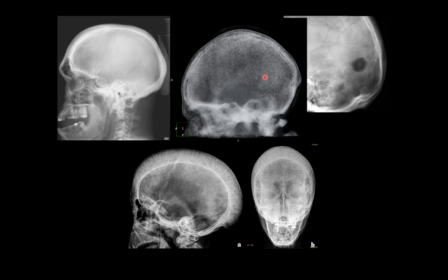Apart from trauma, whenever we do skull X-ray, we can see a lot of other diagnoses as well. It may be infection, trauma, neoplastic, metabolic, endocrine, or whatever. So if you see the first image, this skull is enlarged. This is ballooning or enlargement of the pituitary fossa. The sinuses are also enlarged. This mandible has a different angle, which is known as prognathic jaw. This is typical for acromegaly.